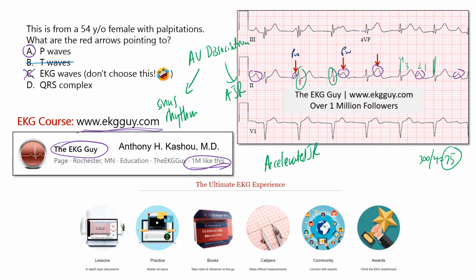So you have AV dissociation, okay, because you have a ventricular rate that is greater than the atrial rate, and you have 2 associated rhythms that you also have to code. So if you're a cardiology fellow or a tech, you know this already, but you have to code both the sinus rhythm as well as the accelerated junctional rhythm to qualify for an accurate diagnosis, okay?